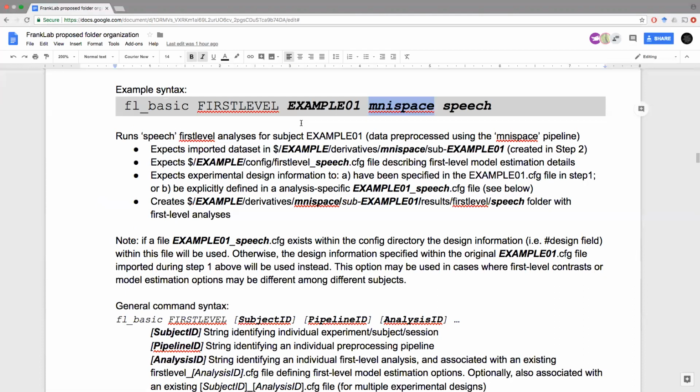So when you run the display or the second level analysis using the same syntax that you use for the volume level analysis, only now for surface level data, it will give you a display for surface level results, and that will allow you to do only non-parametric statistics instead of allowing you to do all sort of different things.